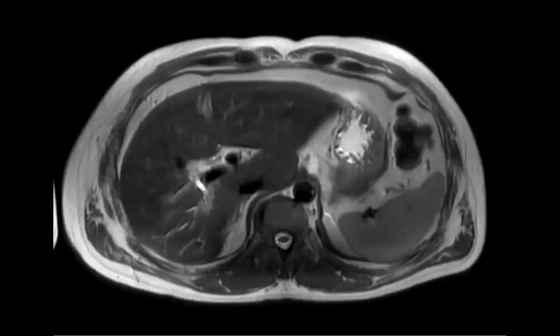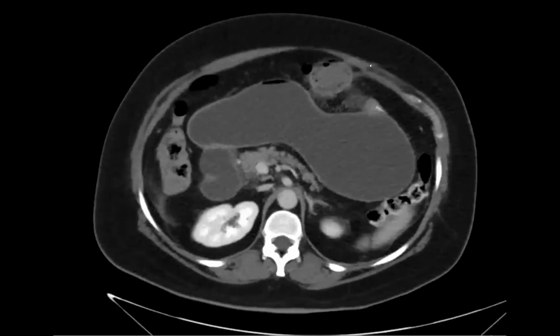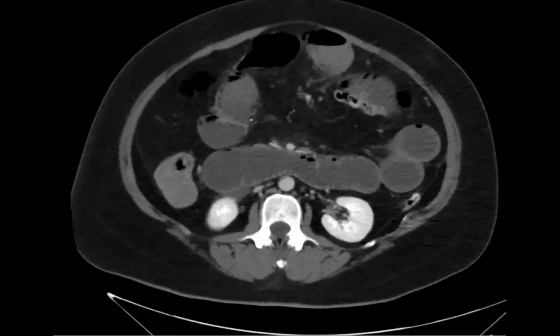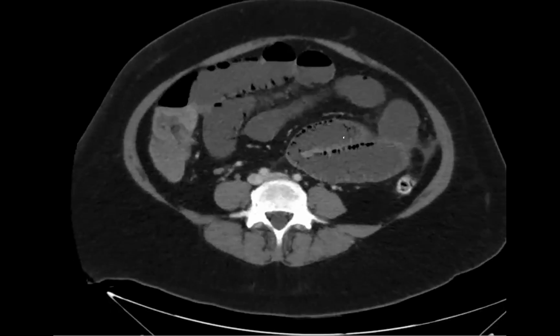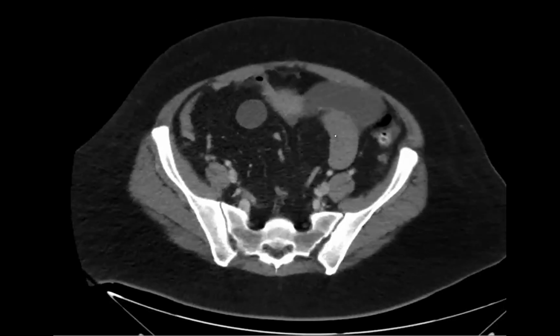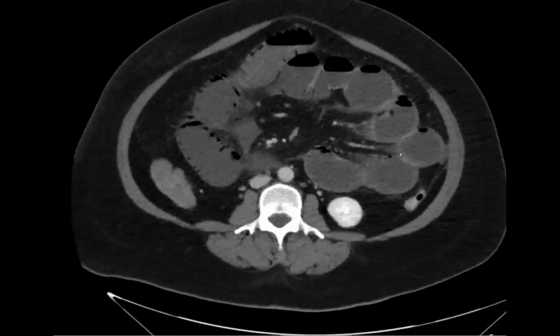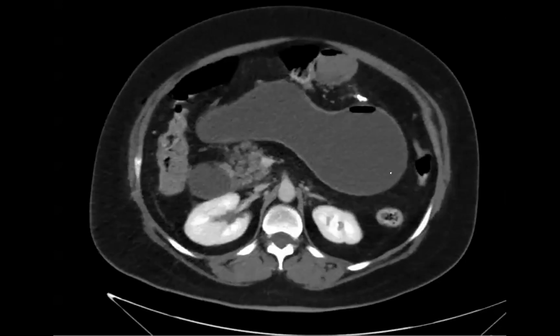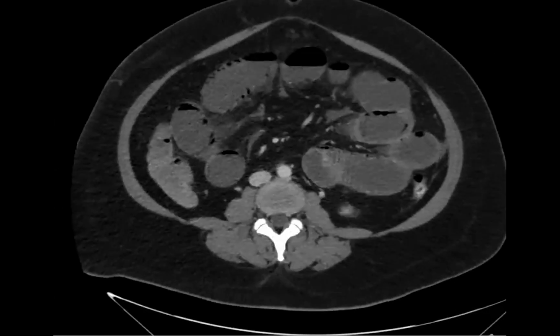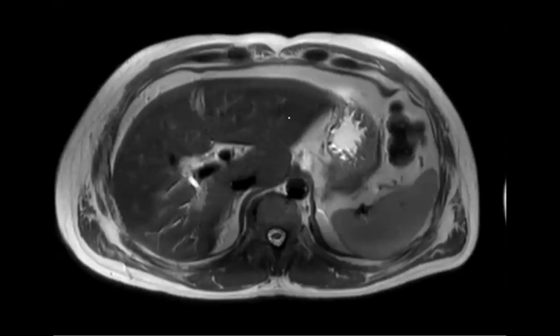And sorry, what was causing the whole thing? So she had surgery. She had gastric bypass, and then she was obstructed. You can see that she has some small bowel ischemia, but it also looks like afferent loop syndrome, like the excluded stomach was super dilated, or maybe it was all backing up. She had distal obstruction. I don't remember exactly what she was obstructed from, but everything was obstructed distal to the jejunal anastomosis. So everything was dilated. Crazy case.